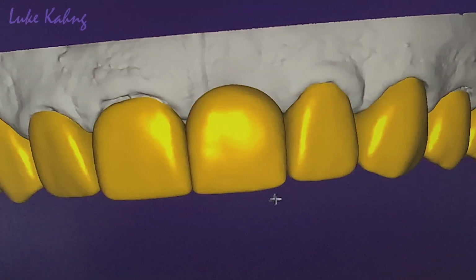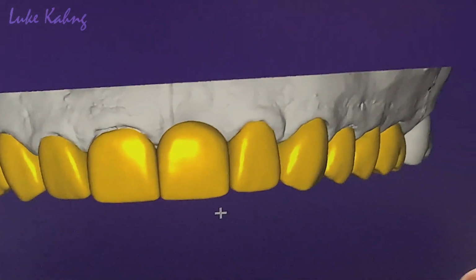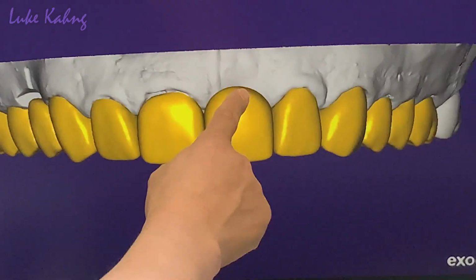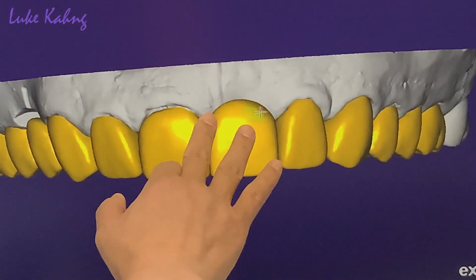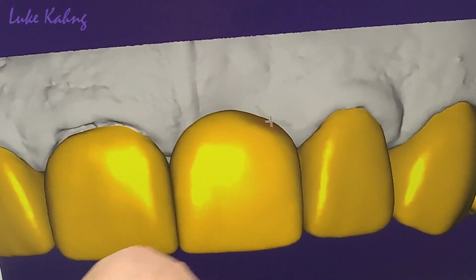Better. So you're getting better, okay? Now make it like this. Okay, make it just slightly. Okay, good. This is funny. Yeah. Okay, now you see the follow, exactly the same, follow the CZ. No, this is good. Only this is the issue. Make a duplicate of it. Bring it down.